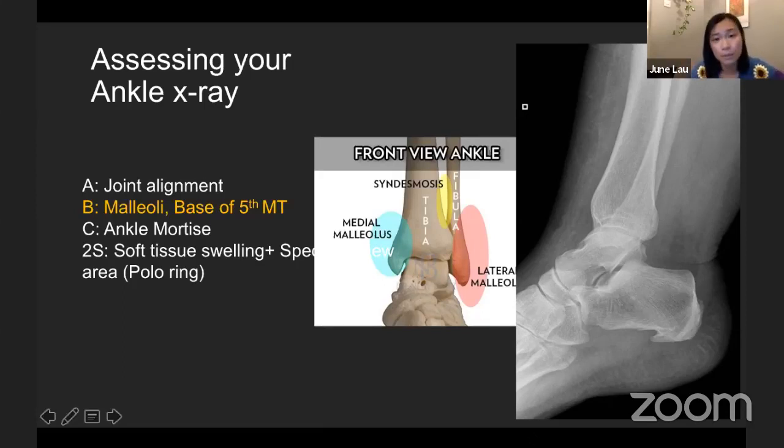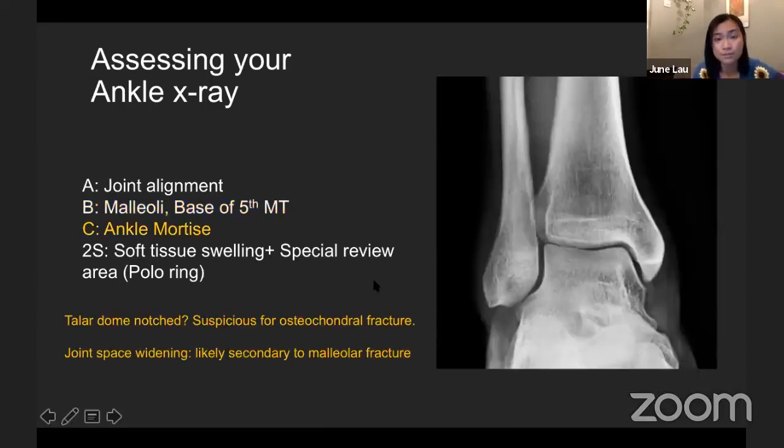So the ankle might look fine, but you might have a fractured base of fifth metatarsal. And your posterior malleolus is this posterior bit. It's not as pointy, but if you see a fleck of bone in this region and someone's had an injury to it, then you have to be suspicious for a posterior malleolar fracture. Often better seen on CT, so with any little fleck of bone, be suspicious and order more investigations.